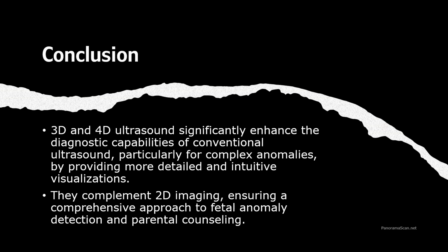In conclusion, 3D and 4D ultrasound represent a significant advancement in prenatal imaging. These technologies significantly enhance the diagnostic capabilities of conventional 2D ultrasound, especially when dealing with complex fetal anomalies. By providing more detailed and intuitive visualizations, 3D and 4D ultrasound allow for better assessment of intricate structures, improving our ability to detect anomalies early and accurately.